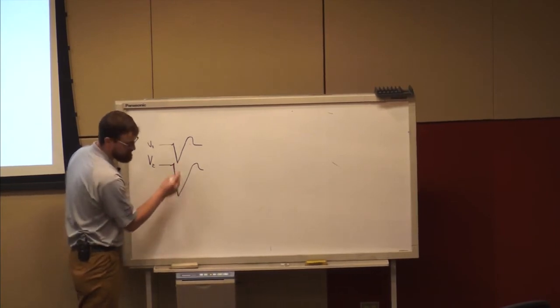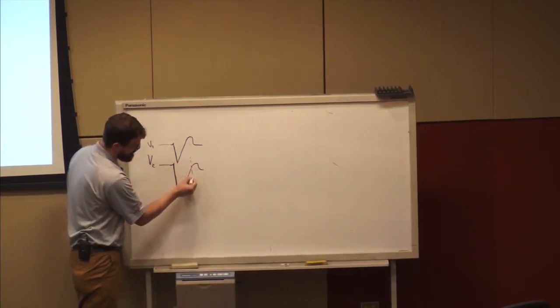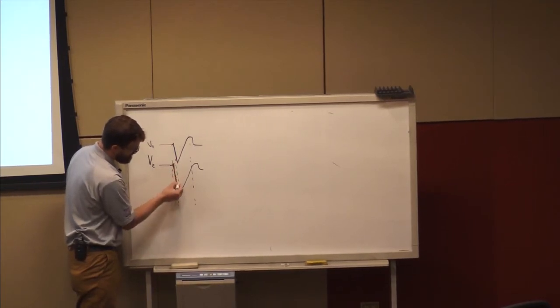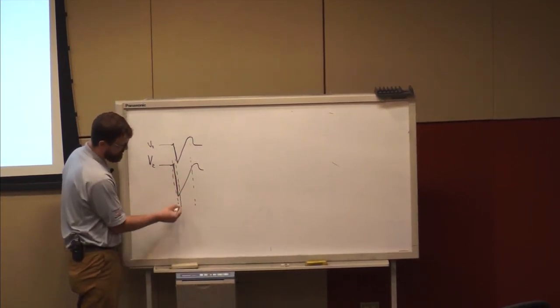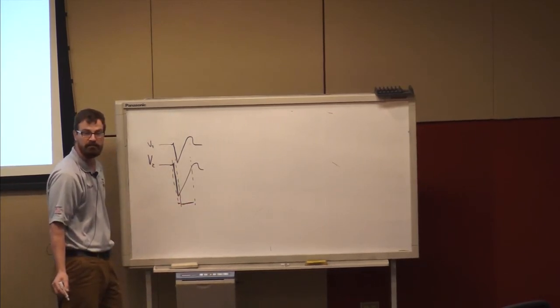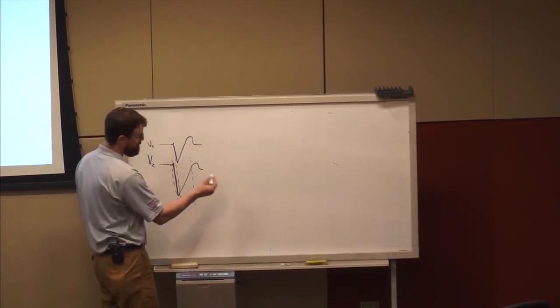Now, if I take this and I split it, and I look at my QRS complex from beginning to end, I actually split the event, and I've got a fast side and a slow side, okay?